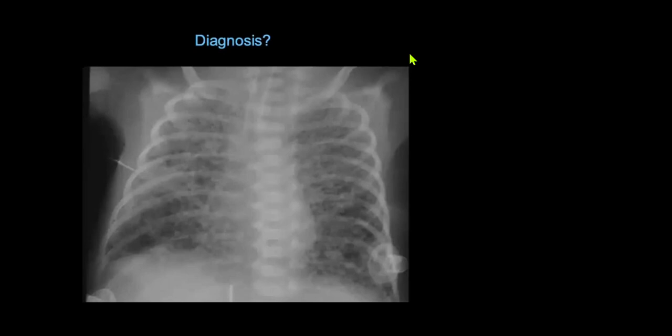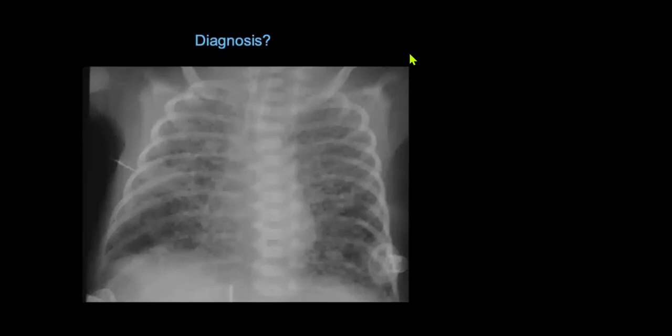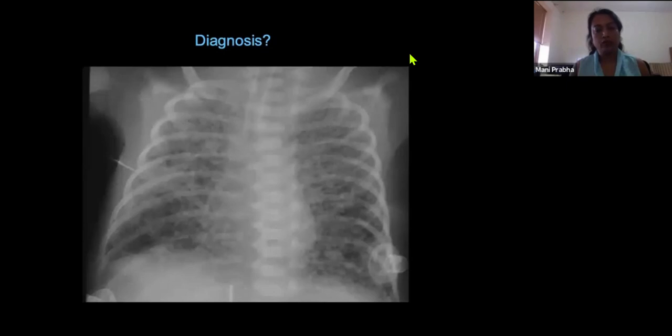So again, I would correlate with the patient's birth history and if they're premature or not, and how old they are. Preterm infant on ventilation. Okay. So given that the patient's on ventilation and was preterm, I'll be concerned about a complication of hyaline membrane disease, such as chronic lung dysplasia or pulmonary interstitial emphysema. Yeah. Which one do you think is going on here?